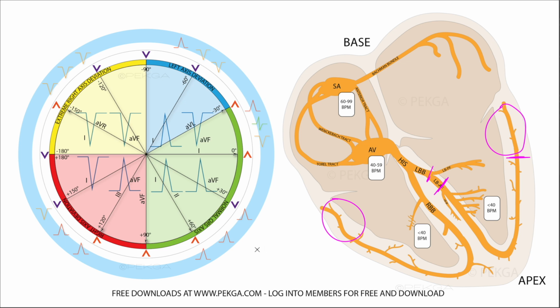Why do I say that? Your R wave is your major ventricular depolarization. So these are your ventricles. Your R wave is representative of major ventricular depolarization. Your S wave, if you have it, right? This is your isoelectric baseline. Your S wave comes from this basal region. Basal region, right? You have the base of the heart. You have the apex of the heart.